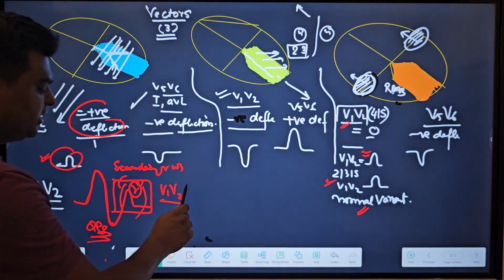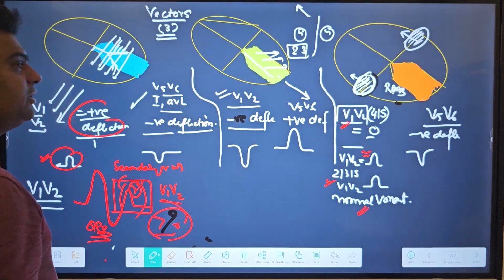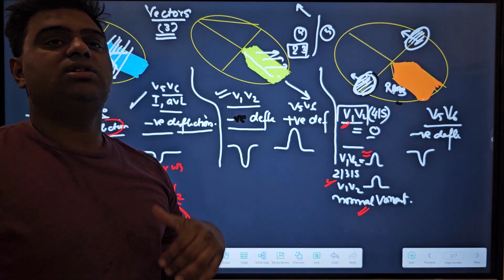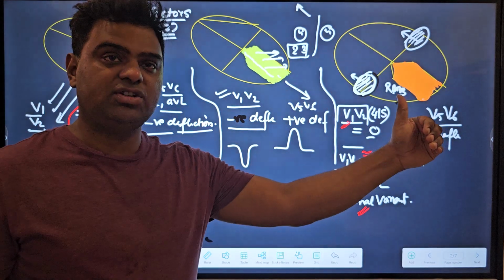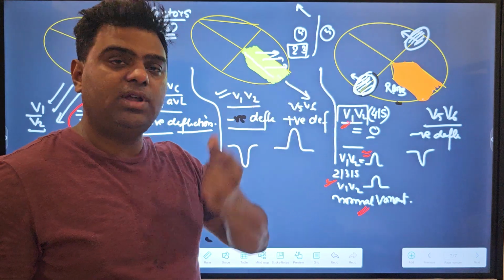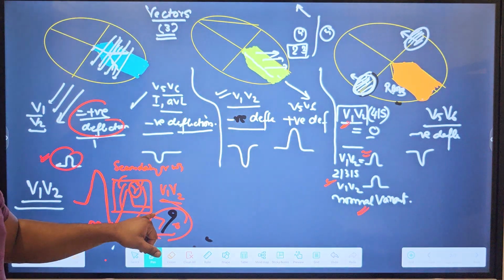In 7% of patients, it has been seen that because of misplacement of leads V1 and V2, we get a right bundle branch block pattern. Because the technician placed V1 and V2 at the second or third intercostal space, V1 and V2 start measuring the depolarization of the basal area. So we get this secondary R wave.